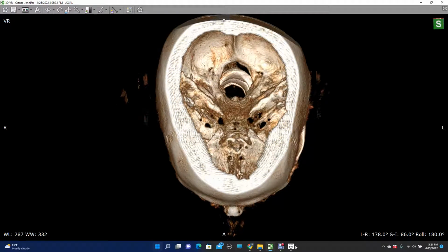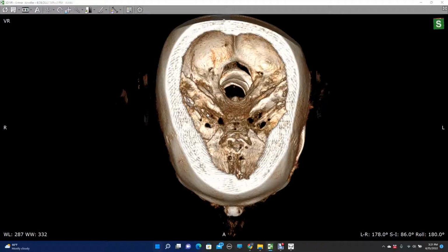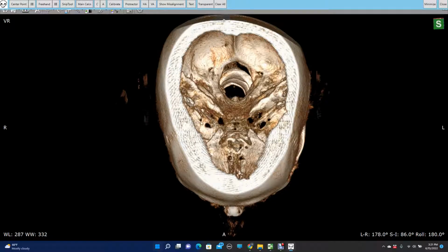And so this is our first application of Toolkit, right? If we open Toolkit, just by clicking it, Alt-Tab will bring us back to Radiant, Alt-Tab will open Toolkit. I just hit those all day. But if I drop the vertical angle right through the middle of that, and right through the tip of her nose or the middle of her head, whatever I can see, I mean, that's pretty straight. That's not really rotated. So I'm going to assume that at -2, she's unrotated. And that's going to be our reference point for a lot of our measurements we do in 3D.